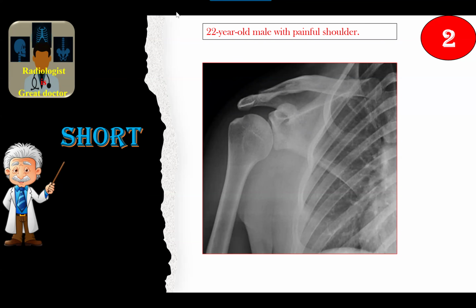No, no problem. Anyone? What is this? Write in the chat. Yes, Hill-Sachs deformity, yes. So we have to know the appearance of Hill-Sachs and the reverse Hill-Sachs or trough sign, the appearance of inferior glenoid fractures, the common associations with shoulder dislocation.